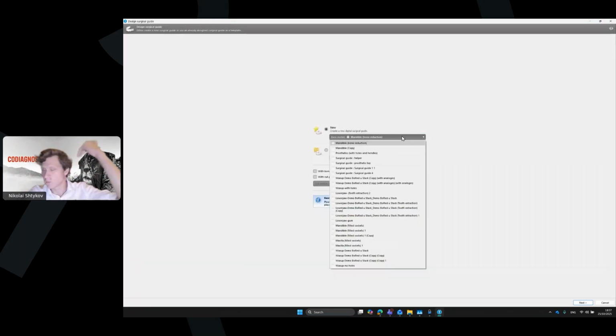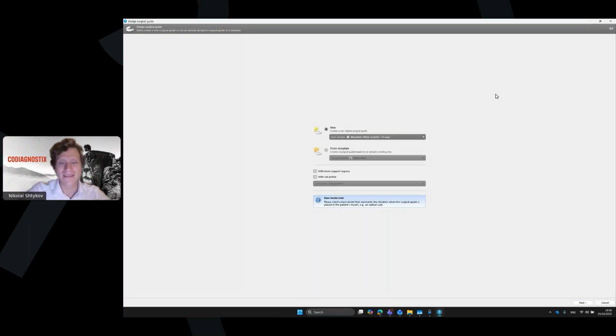You will find this useful when you work with complex cases. When you upload a lot of STL files in coDiagnostiX, you can do this. You can upload a lot of files here, and this is a very nice benefit we have in coDiagnostiX. But sometimes you have a mess when you have a lot of files there. So that's why sometimes you need to rename these cases.